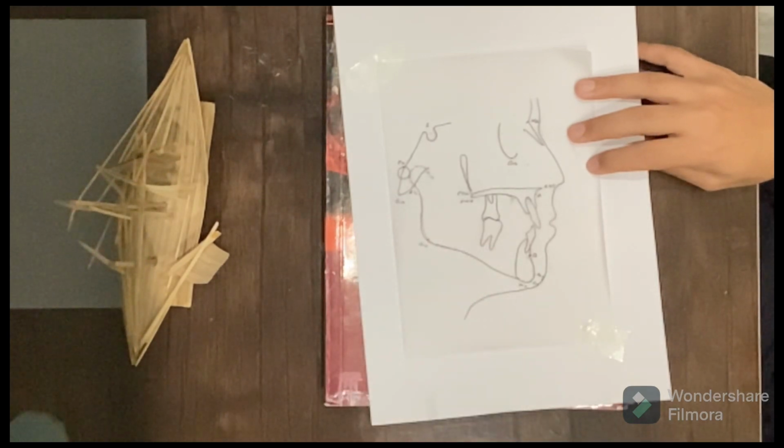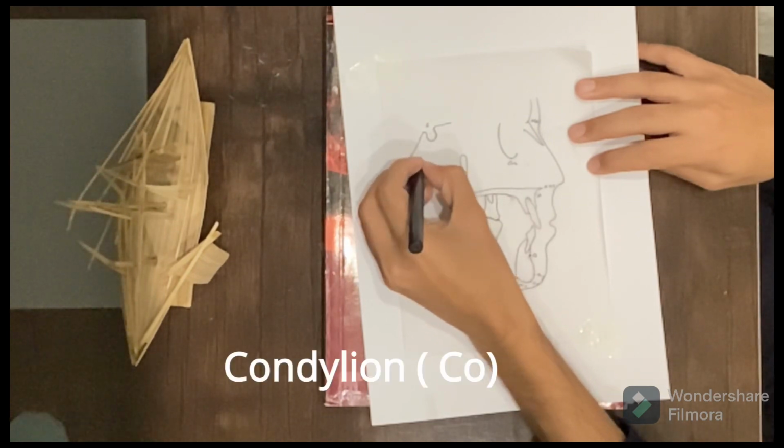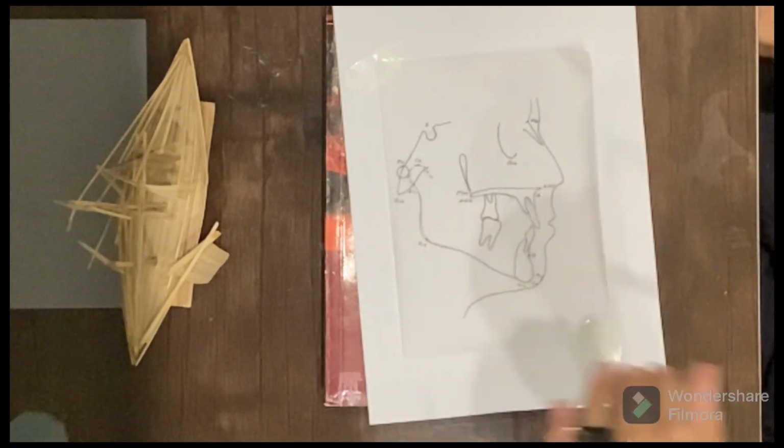Okay, and then there is condylion. Condylion is at the tip of the condyle. So this is the condyle and this is the condylion. The midpoint of the superior margin of the condyle is condylion. Now these are the bony landmarks.